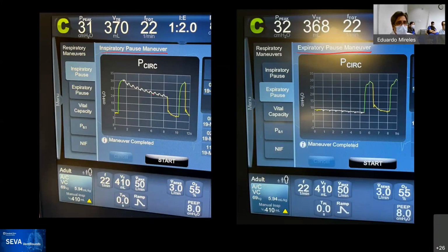So who wants to talk about this? What do you see? Anybody? There's depressurization during the pause, which is supposed to be a zero flow state, implying that there is flow and possibly a leak. Exactly. So with the pressure, you would expect there's always some decay as it relaxes and dissipates.